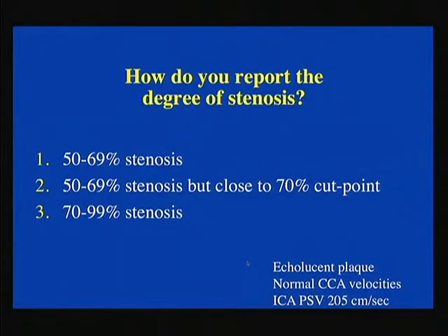And when we survey most people who see this one case, they tend to go along with this interpretation. It's close to 70, but 50 to 69 is perfectly acceptable as a standard of interpretation for this one case, for this velocity range.